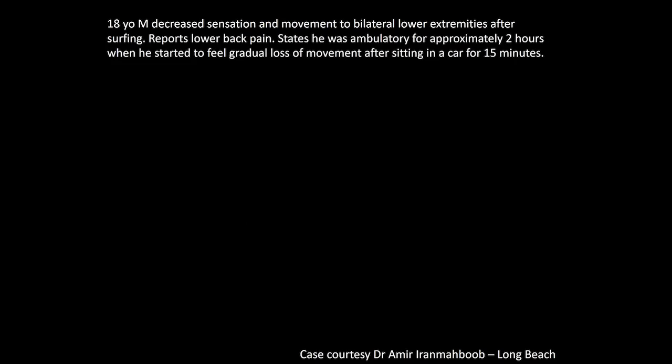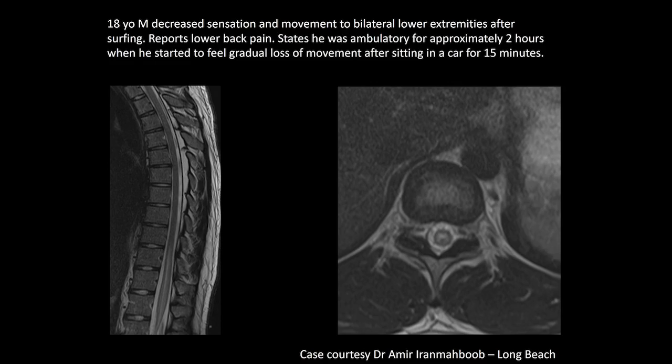This is another very interesting case of an 18-year-old patient with decreased sensation and movement to the bilateral lower extremities after surfing. He reports lower back pain, and then he started feeling gradual loss of movement. This is the MRI, abnormal signal in the conus medullaris.